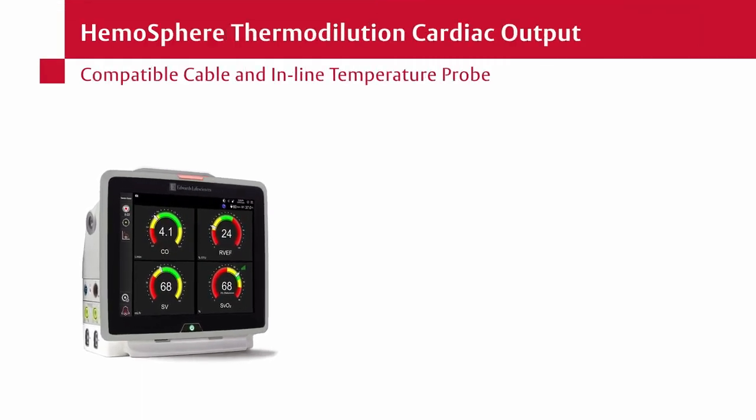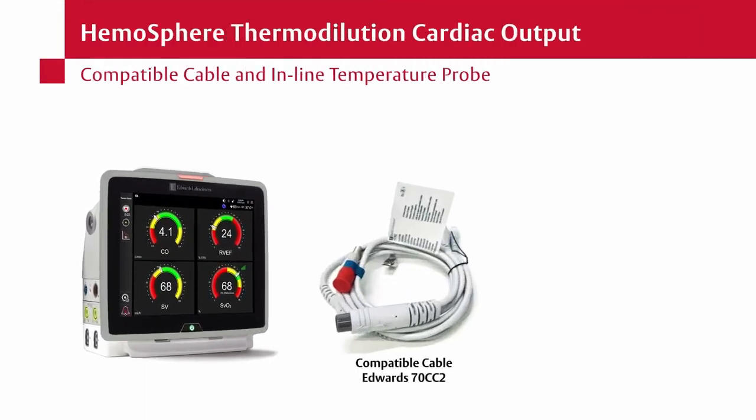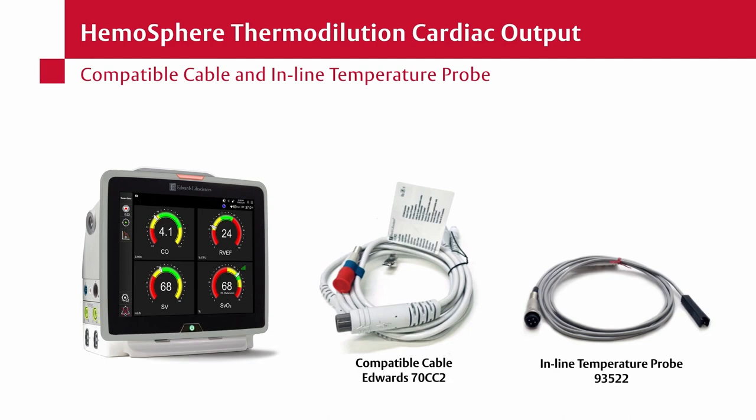Cables specific to the Hemosphere monitor include the patient CCO cable, model 70CC2, and the inline injectate temperature probe, model 93522.